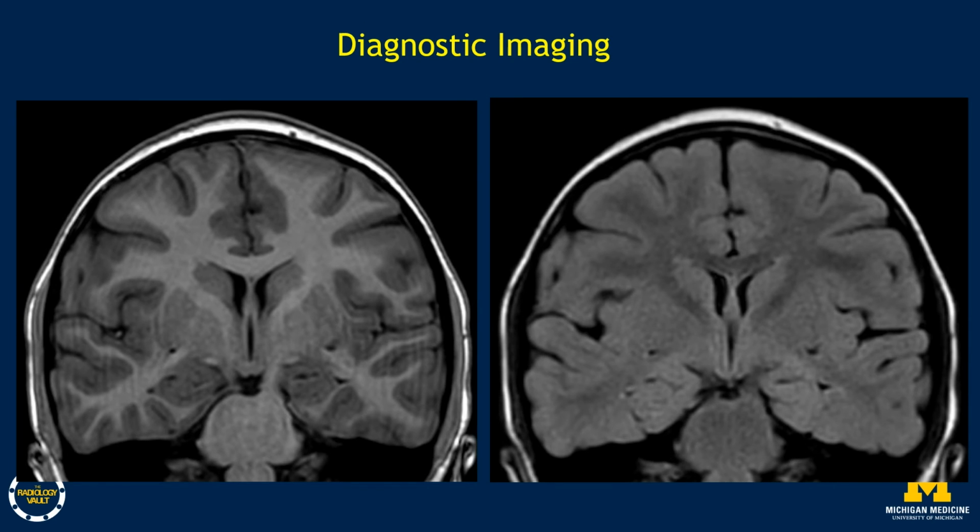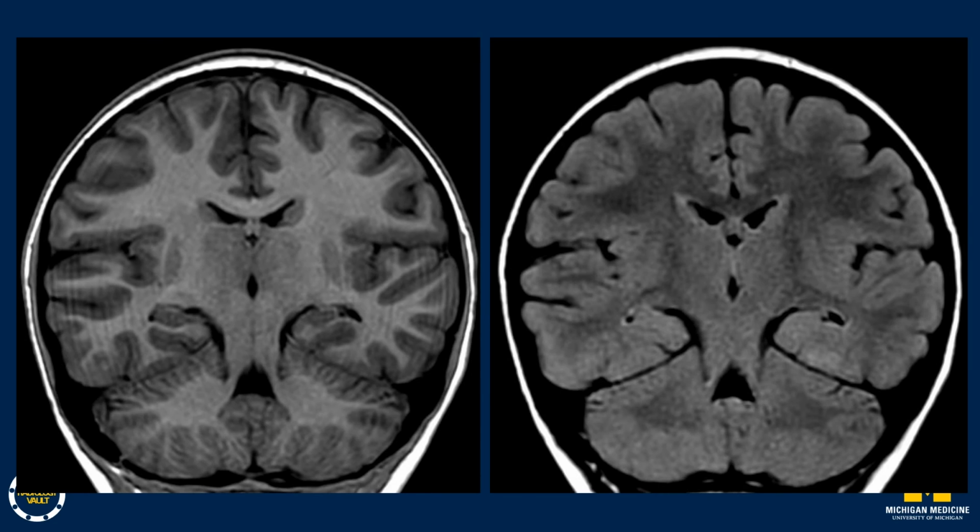The left hippocampus was slightly smaller compared to the right. And slightly more posteriorly, there is an area of subtle blurring of the gray-white matter interface just lateral to the collateral sulcus, and shows hyperintense signal in the same region on the T2 FLAIR.